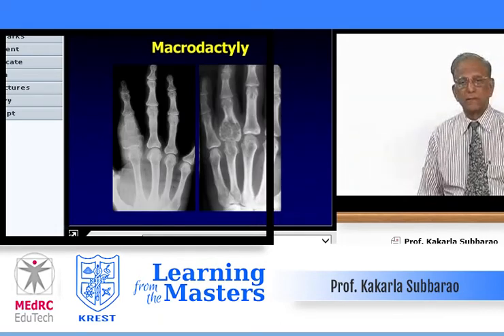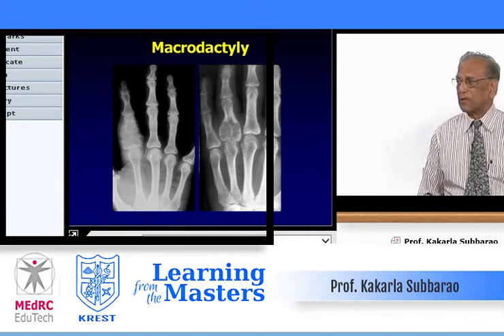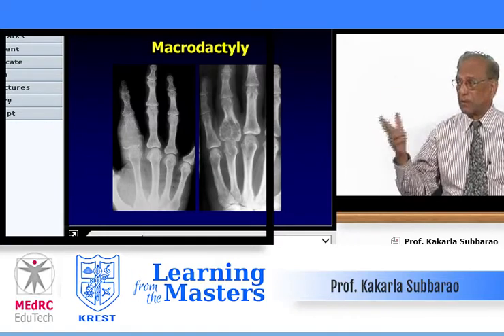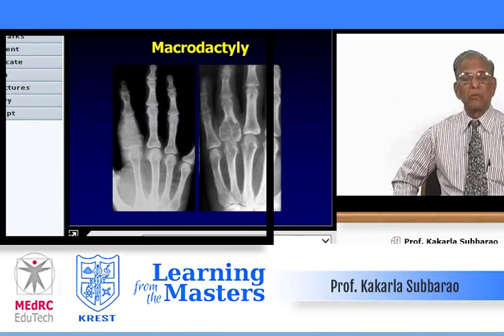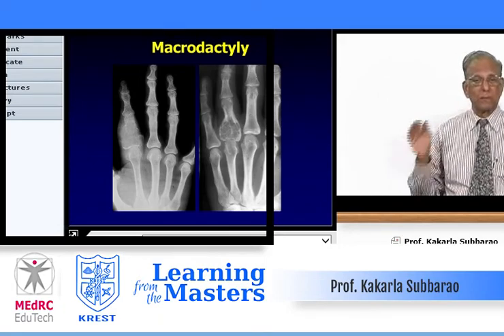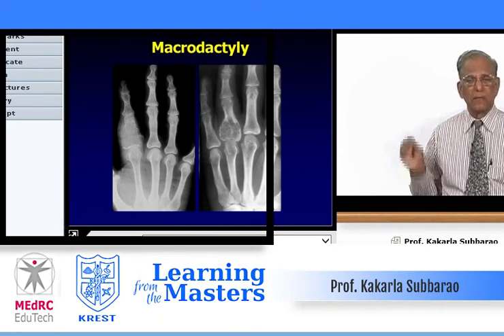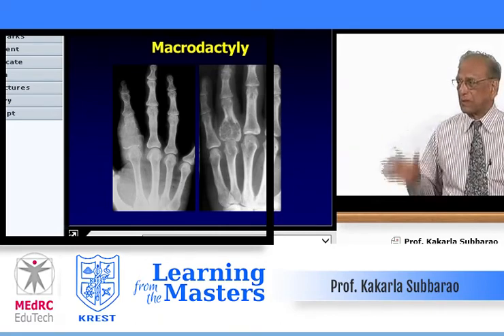Again, two hands. One on your left side, an expanding lytic lesion, with soft tissue swelling. And then if you look at the rest of the bones, particularly the radial aspect of the middle phalanx of the index finger, there is subperiosteal resorption of bone. Whenever that occurs, think of hyperparathyroidism. So if it is hyperparathyroidism, what is this expansile lytic lesion? Brown tumor. The brown pigment is there in the pathological section because of the hemorrhage. This is a brown tumor in hyperparathyroidism.